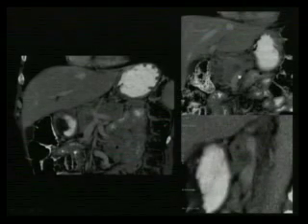What else do you see? Focal rounded low density abnormality. When we go to the multiplanar reconstructions, this is probably the same image. And the question at this point is what's going on with the vascular structures around the lesion.